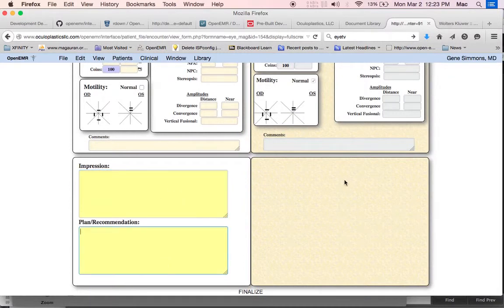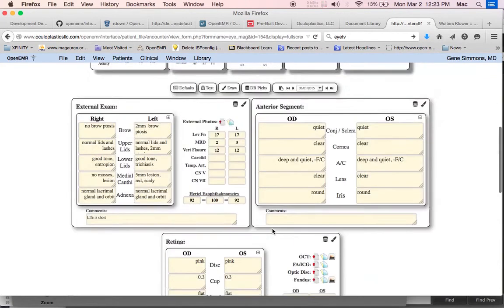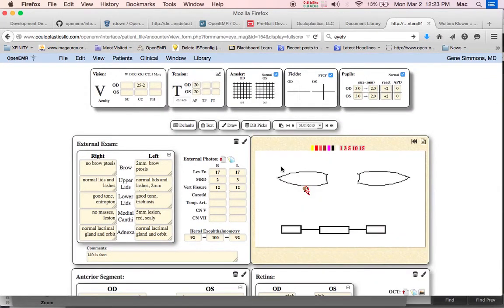There's no logic to it. This is reserved for helper applications for suggestions for coding and diagnostic criteria, and for building problem-specific impression plans. At least that's what we have planned for the future. Finalize down here, this will finalize it according to openEMR standards. I need help developing this portion as well. Need to e-sign it and lock the document. Also, when that happens, the images which are stored for the patient need to be cleaned up.